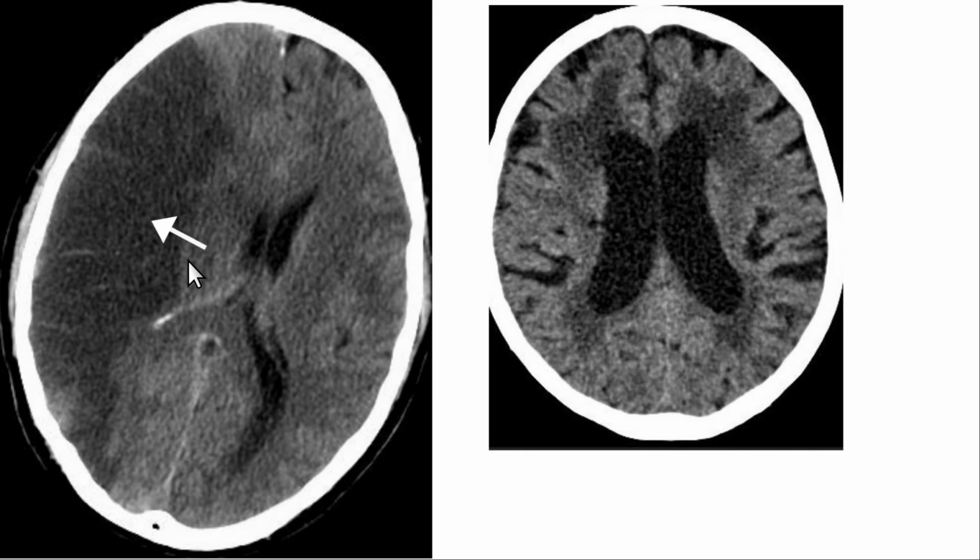Okay, here's a big stroke. You always imagine that the patient's feet are towards you. So this is the patient's right side. Here's the patient's left side. So this is the right middle cerebral artery along the convexities. And this is a large, we call it an MCA infarct. So this is a very poor prognosis. The patient will get weakness on the other side of the body, the left side of their body. And they'll often have significant cognitive impairment, of course, from such a big stroke.